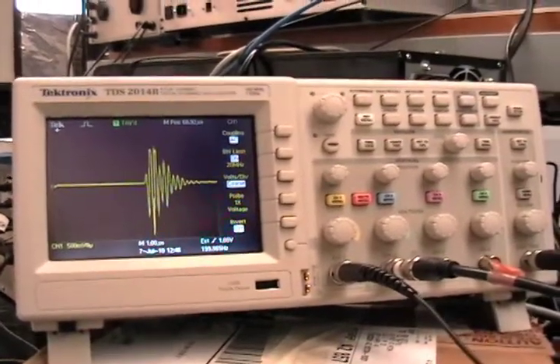This is where in here is basically we're doing research on stuff before it actually goes to be used for clinical applications.